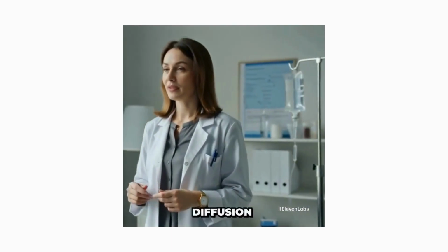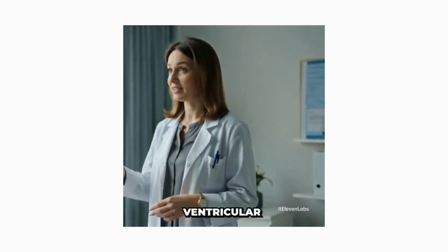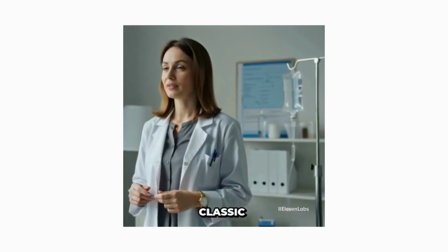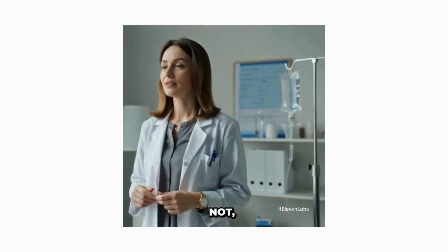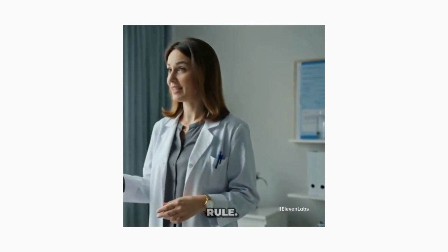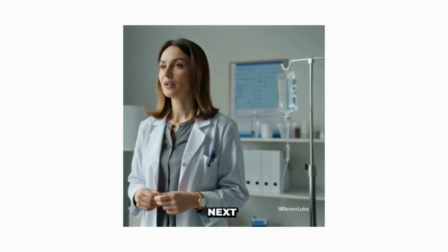Look at the restricted diffusion and the origin from the fourth ventricular floor. This was a classic ependymoma. If you got it right, well done. If not, remember the roof versus floor rule. I hope this helps you in your next shift.